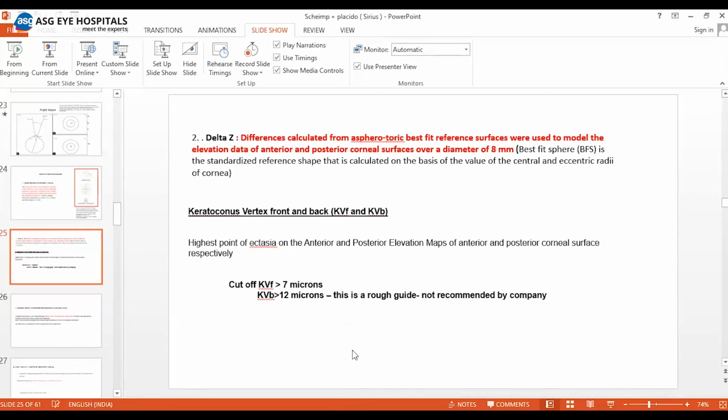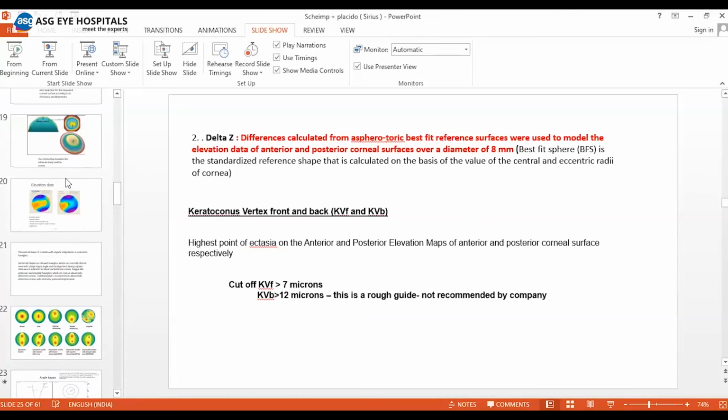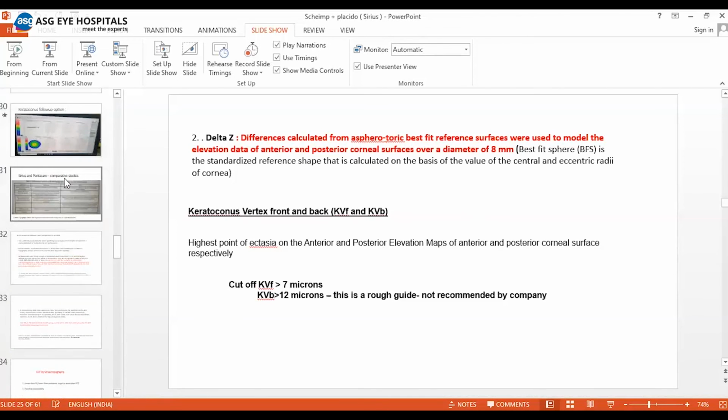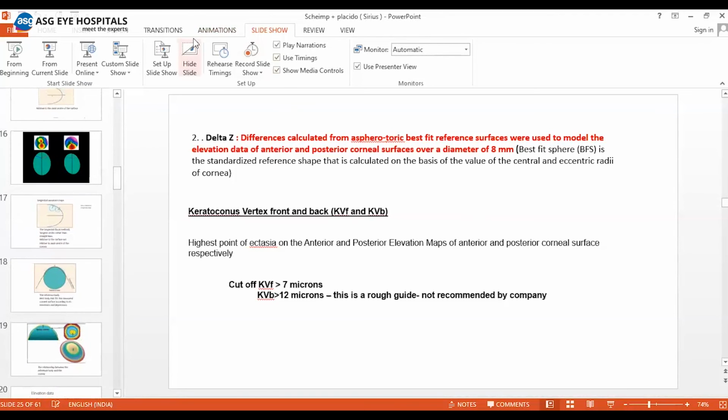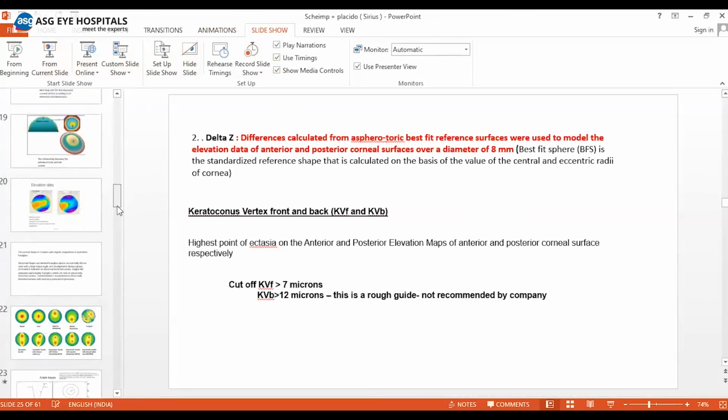Hi, sir. Hi, ma'am. Just wanted to add, as ma'am also said, there are not very clear guidelines, but there are some rough cutoffs in some areas that most of us use. In normal practice, many times a patient comes with a Pentacam or Sirius from elsewhere, and we have to see what is happening, what the follow-up is like. Ma'am, if you could show me that map with the 5 columns, the summary indices. I use it exactly like Pentacam, with a few rough guidelines that I learned from my seniors and colleagues.